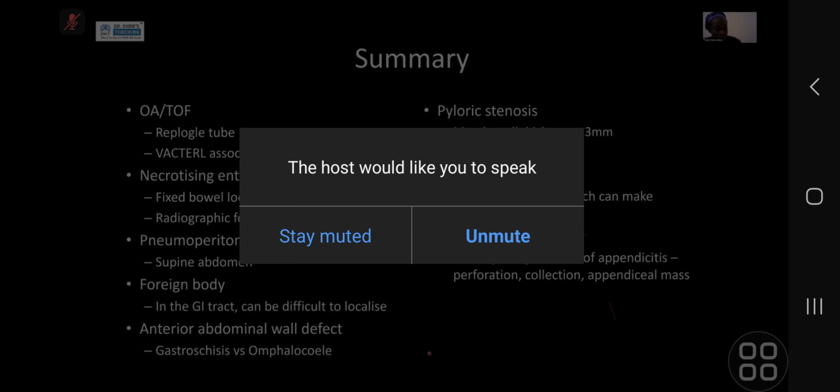So the radiographs aren't to diagnose gastroschisis or omphalocele. That's when you diagnose clinically. The radiographs are to look for any bowel dilatation, which you can see if there's a concurrent atresia or there's been a stenosis. And then they're also often because they've put lines into the patient, so we're doing it to look at the lines. And often they'll have already repaired it before they've even done the initial radiograph, but those were just some good cases to show you if you've not seen them before, because they could come up in exams.